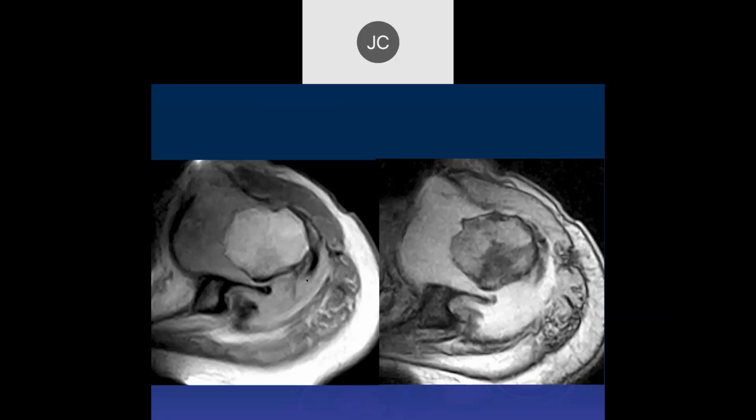Well, it's hard to tell what's normal here. That's a low field scanner. Here's the glenoid. There's the humeral head, markedly irregular, with a big effusion associated with this. Right. And this was severe congenital dysplasia.